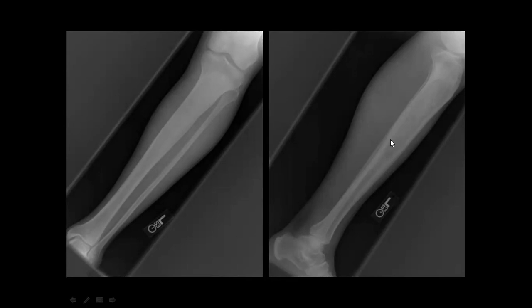Yeah, Nirmin, I know that you would like to jump to the final diagnosis, but to discuss, because you know that it is a bit tricky when you should put other differential diagnosis, right? So I agree with you that probably one of the most important will be fibrous dysplasia, sure, which is a long lesion in a long bone. Okay. So if it is a long lesion, long bone, one of them. Okay, let's go to CT.